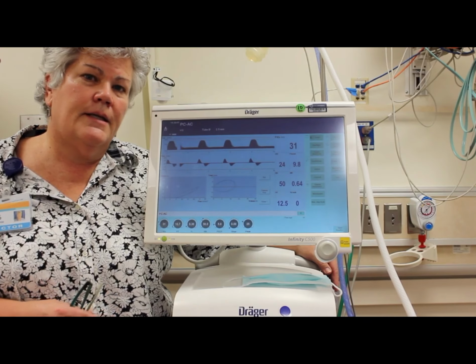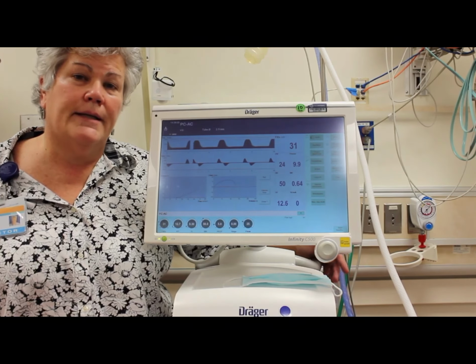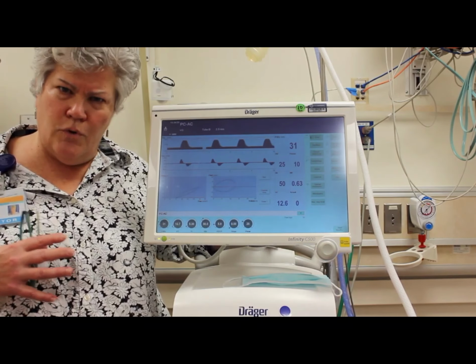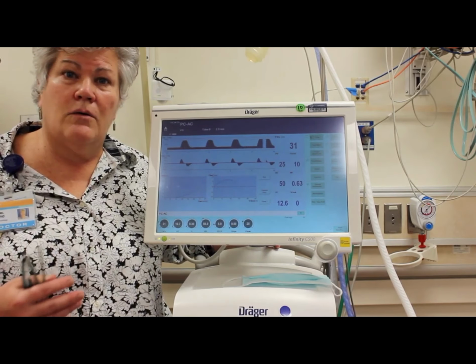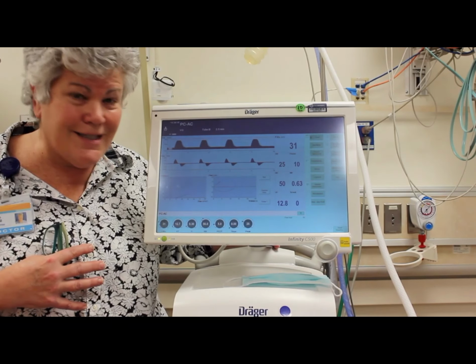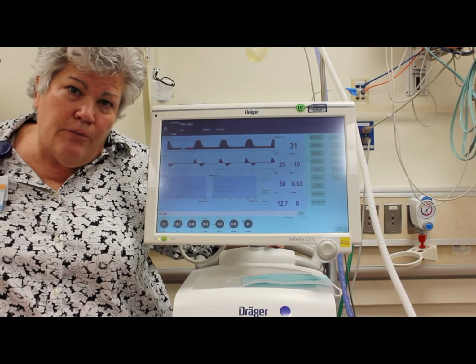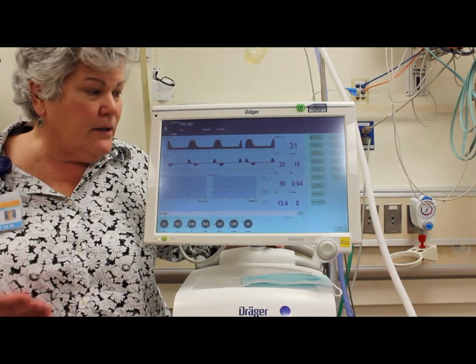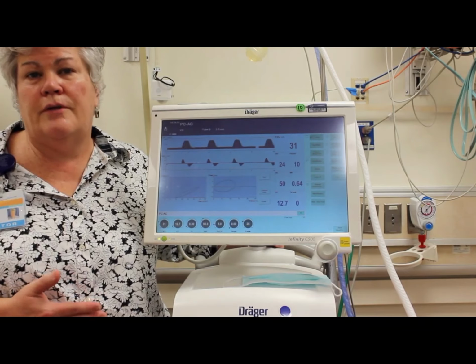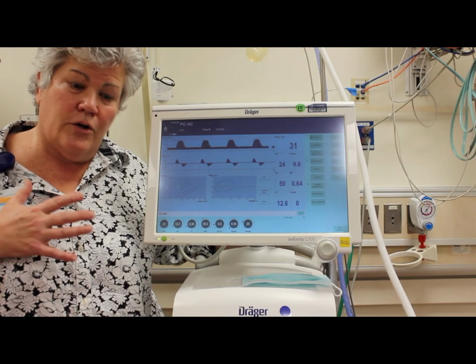The problem is, with each breath, the pressure is exactly the same, no matter what the compliance of the lung. Meaning, in the beginning, the lung can be very stiff and difficult to move. As the surfactant kicks in, or as the baby gets a little older, the compliance gets easier, and the chest is easier and easier to inflate. The goal is to put in a volume of about 5 to 6 mLs per kilogram. If the baby only weighs a kilo, we are shooting for about 5 to 6 mLs. Remember, the tidal volume is the amount of volume that is required to expand the chest.